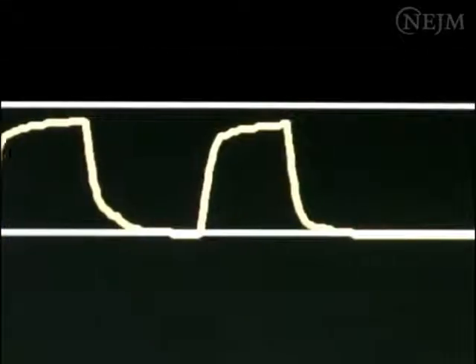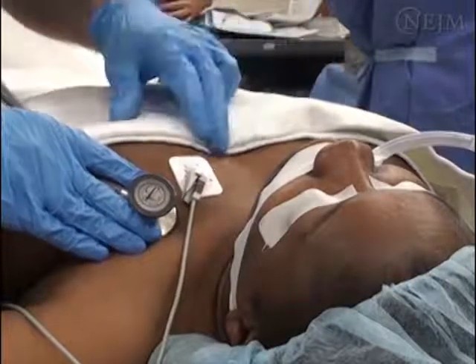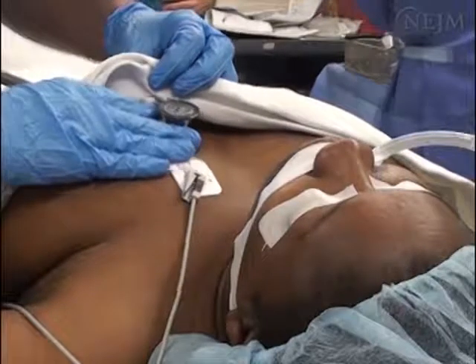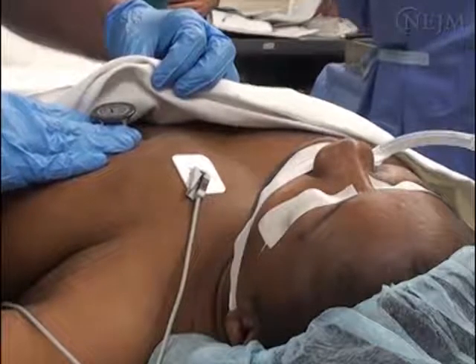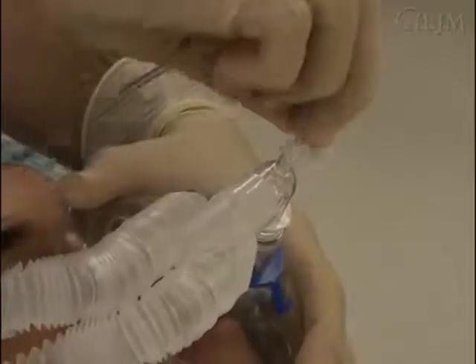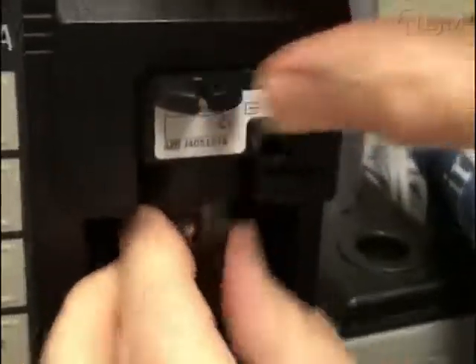Artifacts should be the last explanation for changes in critical values. Therefore, when a low or high carbon dioxide reading is obtained, a physical assessment of the patient must be performed before the assumption is made that the values represent equipment malfunction. If the patient appears to be clinically stable, consider the possibility of either leakage or occlusion of the sampling system. Make sure that the side stream sampling line is well connected to the circuit and to the water trap on the capnograph, and that the water trap is firmly attached to the capnograph.